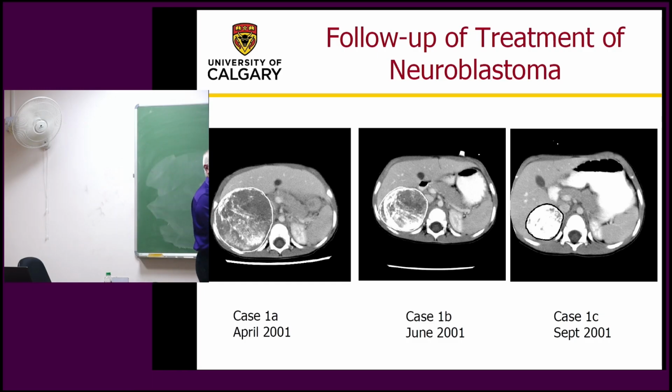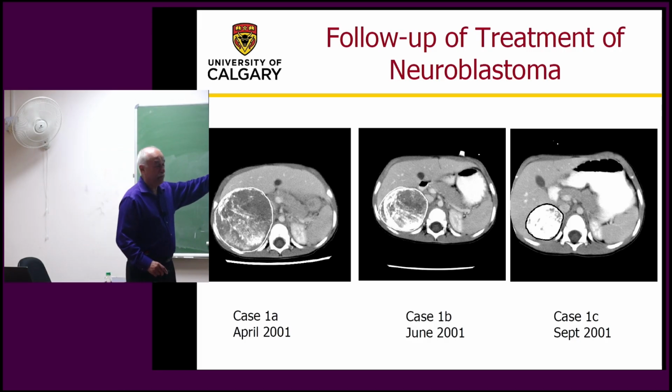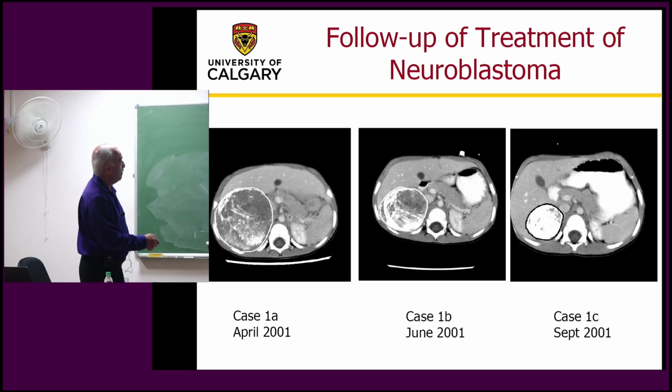But I'm telling you clearly, this is a hand-drawn contour. We could not get to that level of detail and precision for all tumors. So here is that example showing good response to treatment for this patient.